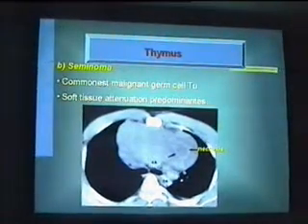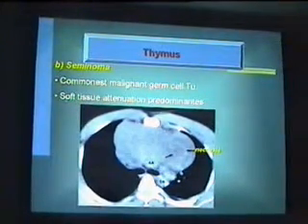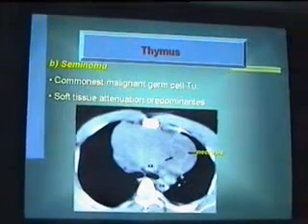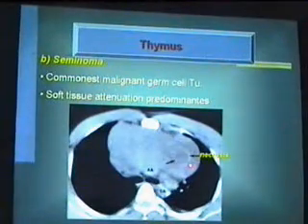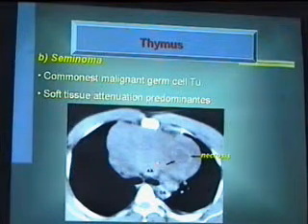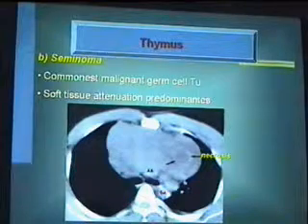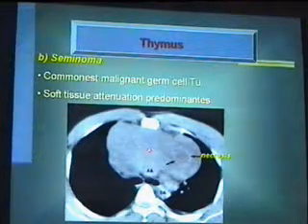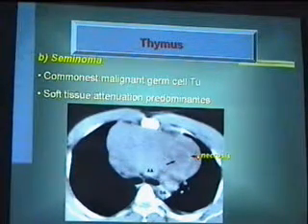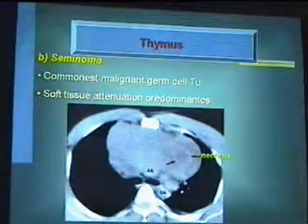قلنا السيمينوما اشهر كتير من الكوريوكارسينوما the malignant version of germ cell tumor commonest malignant soft tissue attenuation predominates. الثانيه بقى التيراتوما كانت السيستيك component predominates هنا السوفت تيشو predominates ونلاقيها مهاربرين برضه the anterior mediastinum this is the sternum اهي شايفين الاسندنج الاورتا يا جماعه وصلت لفين؟ اللي وصلت لغايه bifurcation. بصوا قريبه ازاي من الديسندنج الاورتا because it has been completely displaced by this large soft tissue anterior mediastinal tumor. نلاقي فيها areas of necrosis and breaking down because of the malignant component.